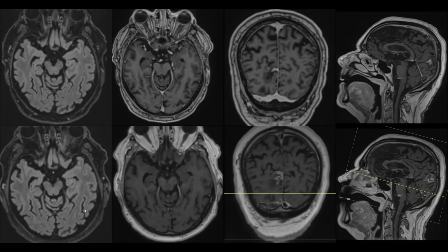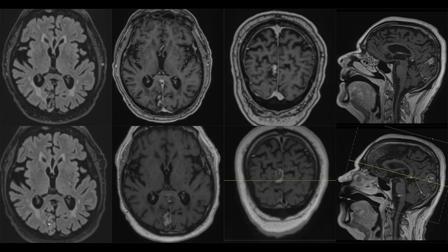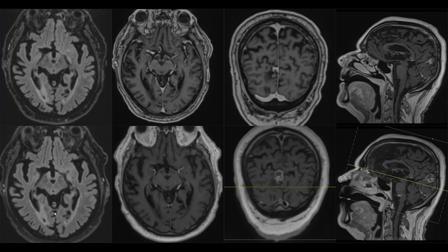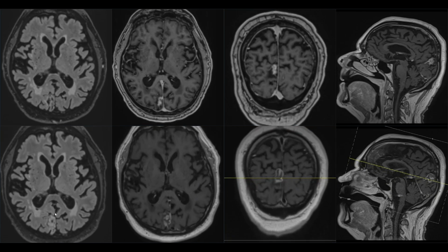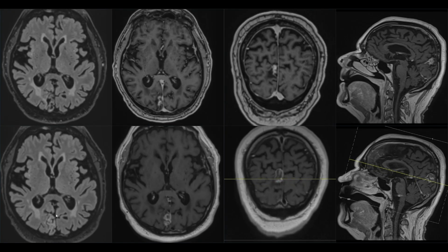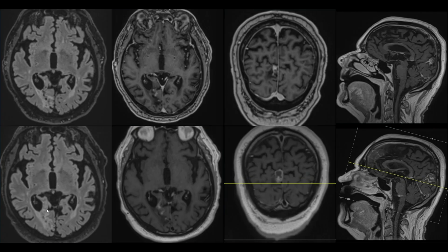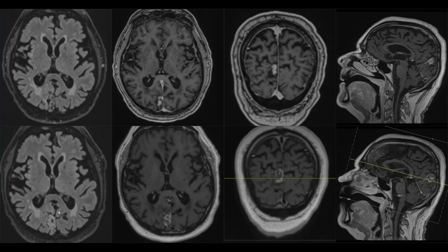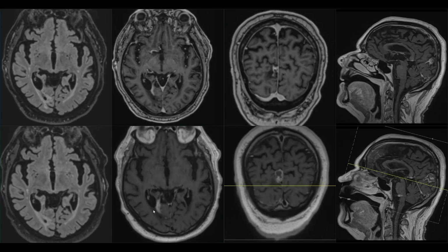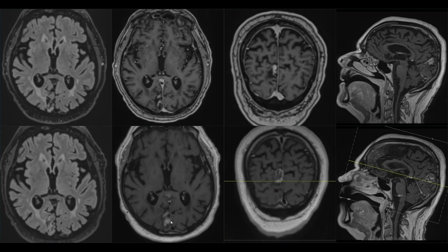It has been stated in the original report that the location of those areas is strongly suggestive of the status post recent infarctions, not acute but subacute to early infarctions. This is a case of the posterior cerebral artery territory. However, how would we describe the contrast enhancing areas?